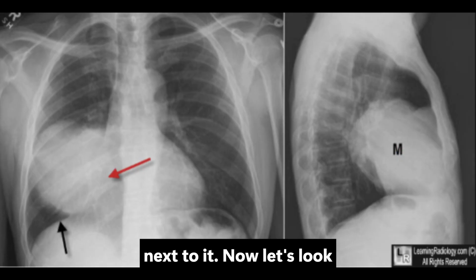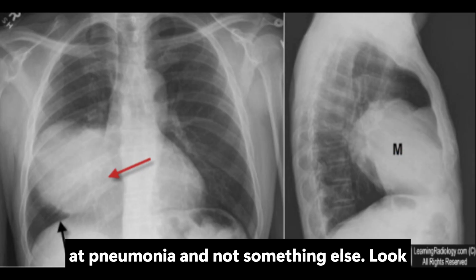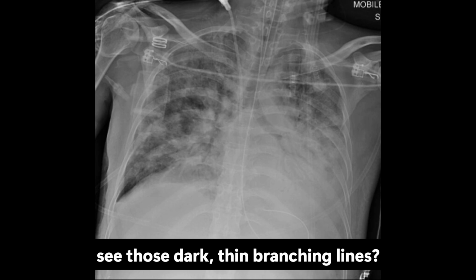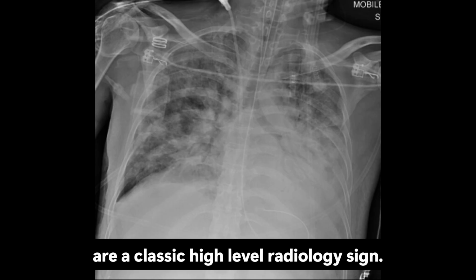Now, let's look at a sign that proves you're looking at pneumonia and not something else. Look closely inside that white cloud. Do you see those dark, thin branching lines? Those are called air bronchograms. They are a classic high-level radiology sign.